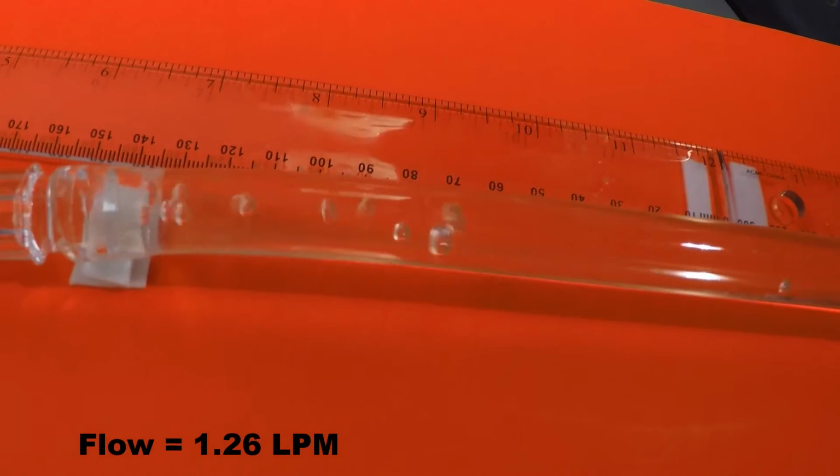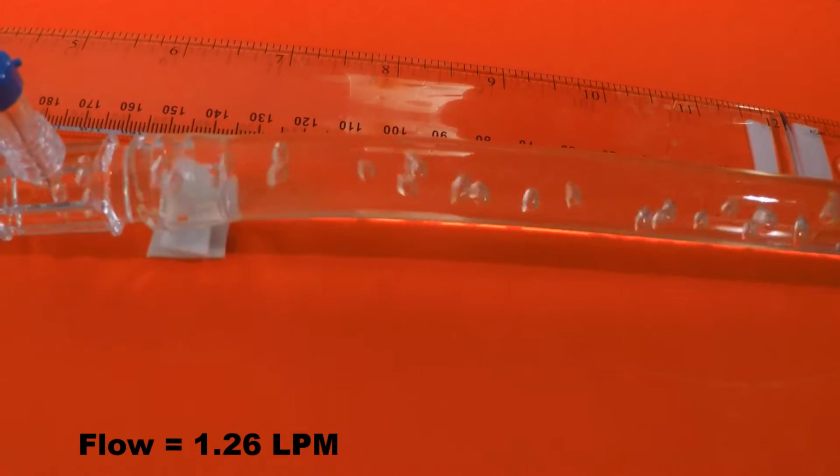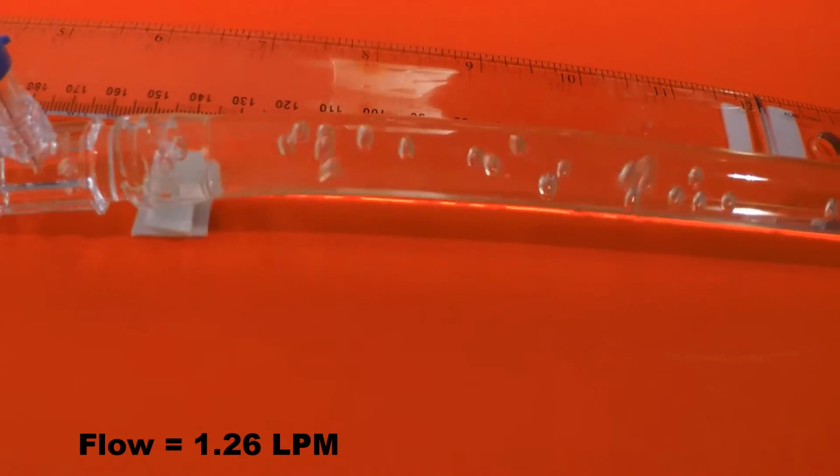In part 2 of this series, we will attempt to visualize the effects of flow on air bubbles trapped within a clear blood analog fluid. In the first view, the camera is turned on its side and air is slowly injected into a half-inch tubing at low flow using a 10 cc syringe with 25 gauge needle.